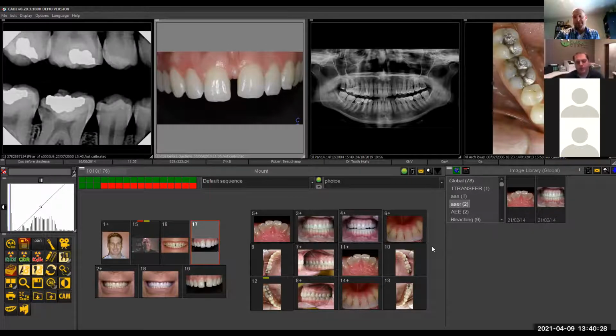Yeah. I'm assuming that when you set one station up how you want it, you have everything in preferences. You can just copy that preference file over to any other operatory to keep them the same. Exactly. You can save, and when we install, that's part of it. There's ways that we can just apply to all stations, so we can do that.